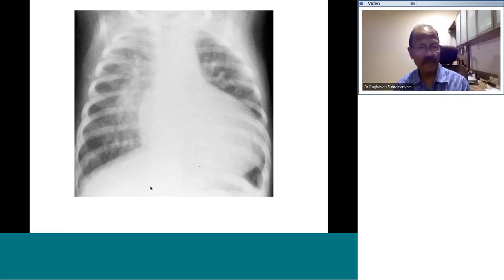Now, this is an unusual type of plethora. So, no doubt about plethora. There is a huge heart, the plethoric lung, big hilar artery, very, very large vessels, a lot of end-on vessels, and there is suggestion of pulmonary edema, very plethoric lung in an infant. However, the main pulmonary artery is not enlarged. The main pulmonary artery is concave. How can that be? You have a very large pulmonary blood flow without enlargement of the pulmonary artery. The only possibility is that the pulmonary artery is not located in its normal location.